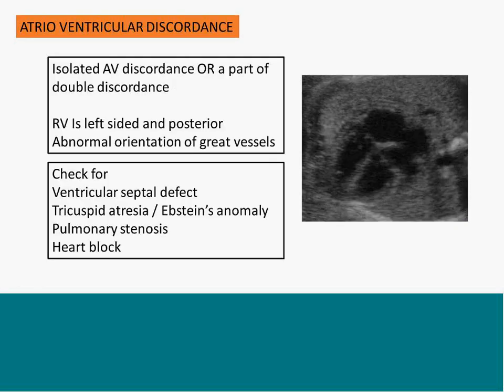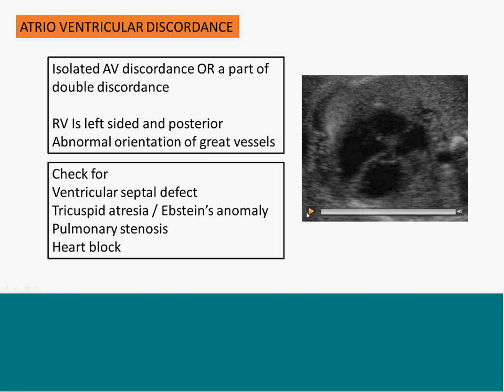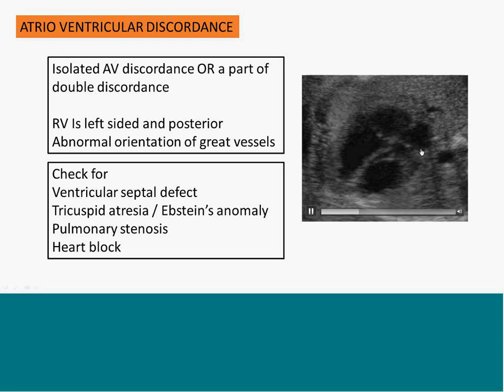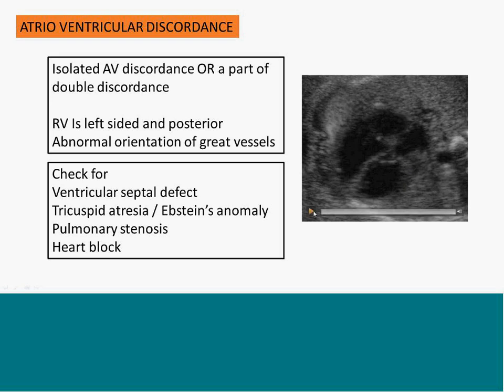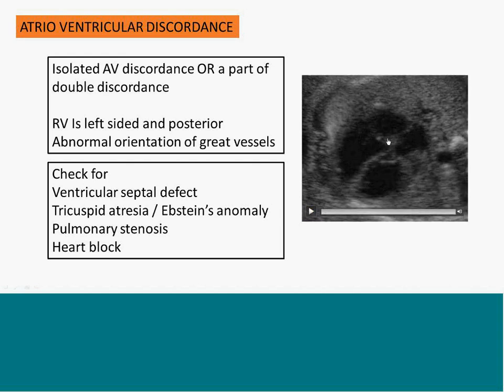Now, in this figure, we can see the gap of the foramen ovale. So this is the left atrium. This is the descending aorta. And along the left atrium, what attaches is the tricuspid valve and the right ventricle. The tricuspid valve is inferior to the mitral valve. You can see here the offset. That is left atrium with right ventricle.